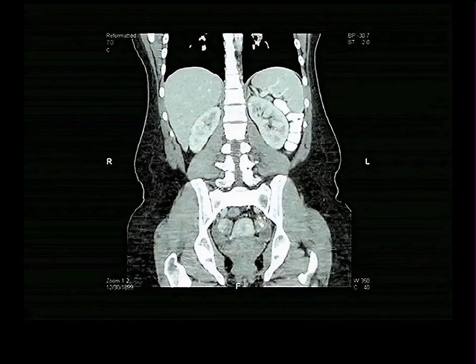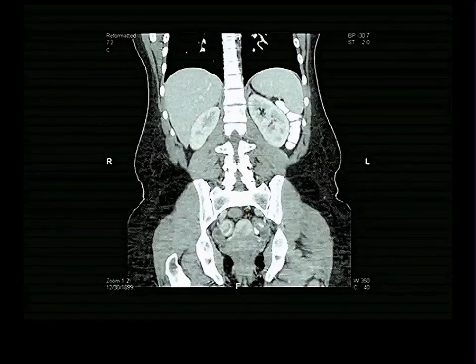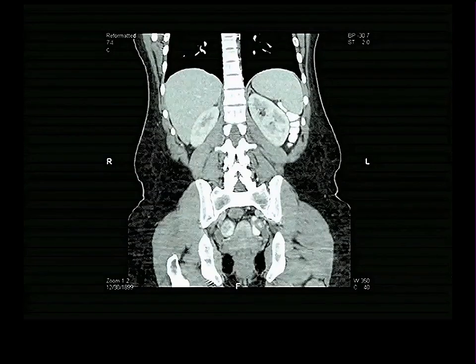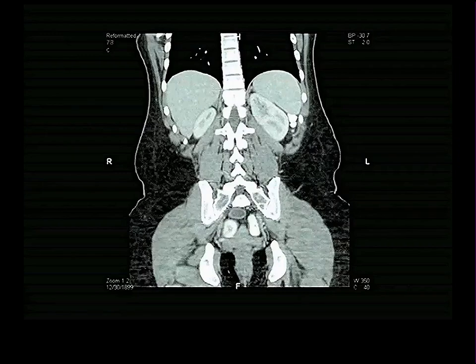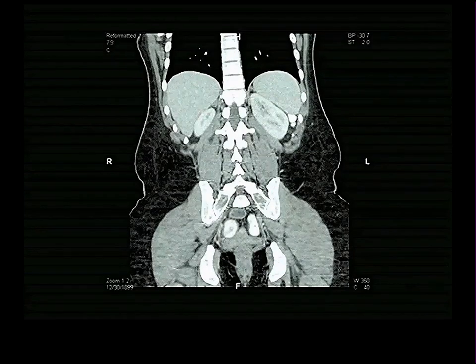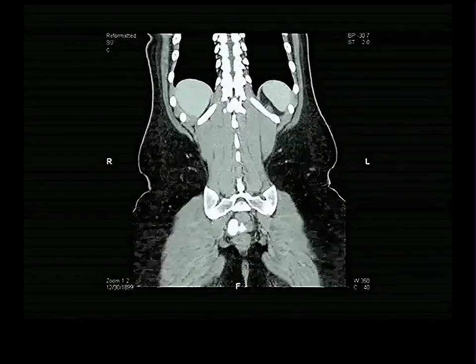Keep on going backwards. Still ovary, ovary, uterus. Keep on going backwards. And that clearly is bowel, because now we see contrast in it. And that's bowel there, so there's contrast. This person swallowed barium. And then behind the uterus is nothing but the rectum, wherever it is. All right, don't care about that anymore.